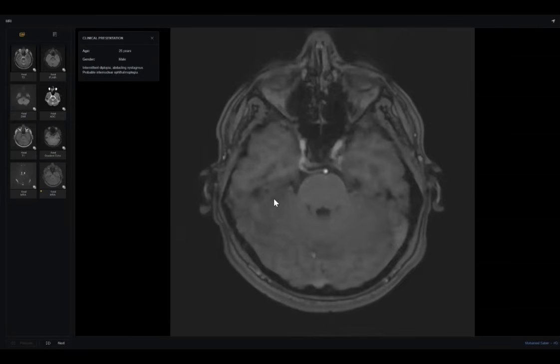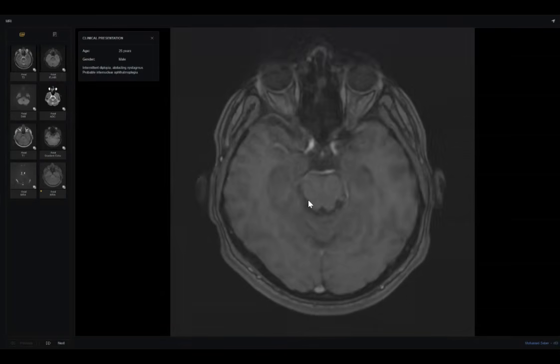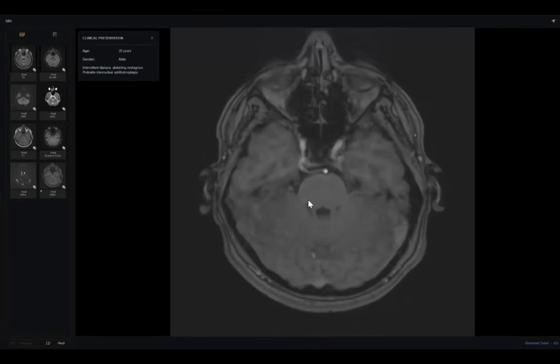See this better. This is the primitive trigeminal artery. And these are the bones, very clear. Go up. This is the midbrain. What is the function of the primitive trigeminal artery? It is a communication between the anterior and posterior circulation, and sometimes it can be the dominant blood supply to the basilar artery distal to its connection to it.